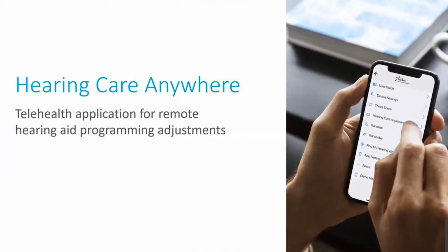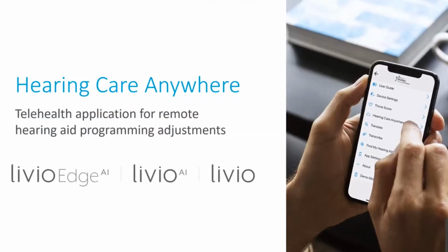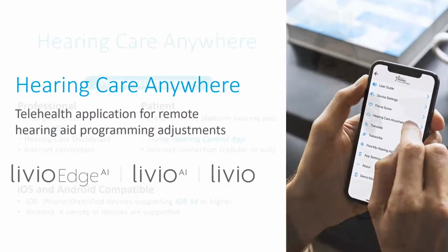Starkey's Hearing Care Anywhere is compatible with the entire Livio range of products. That will include our premium Livio Edge AI, Livio AI, and Livio in all styles and all technology tiers, straight down to the fully subsidized Livio 1000 BTE device.